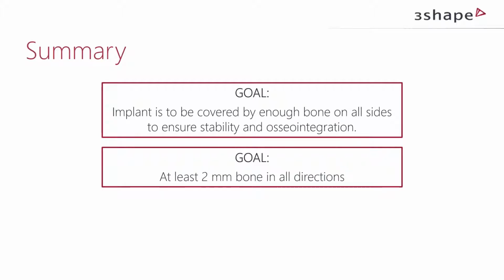Of course, you as a surgeon will know when to deviate from this rule or these rules, and you do that with your own experience. But as a general understanding, it could be good to keep these goals in mind all the time.